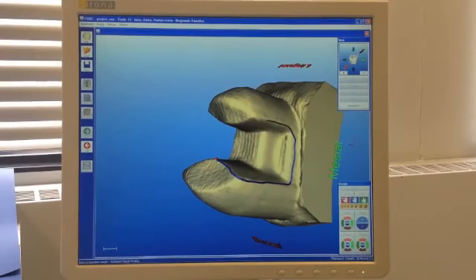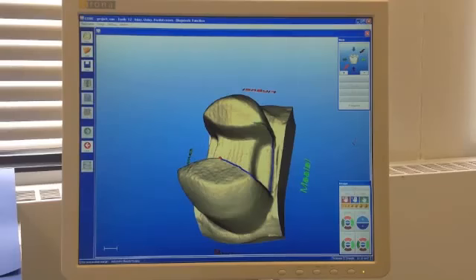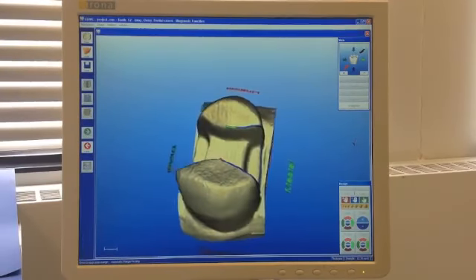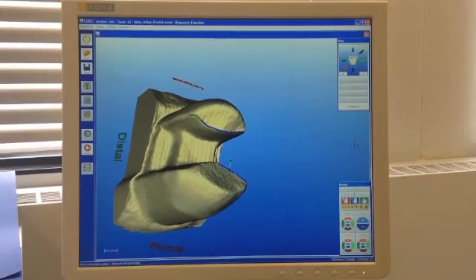If you make any mistakes at this point designing the margin, don't worry. You can go back later on and redefine the margin in any particular spot that you think you need to draw again, or fix corners and things like that.